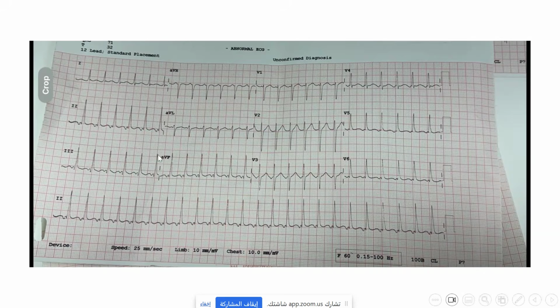If you look to the P wave in long RP tachycardia, considering the patient is young and the P wave is inverted, likely it's not sinus tachycardia. So atrial tachycardia is a possibility in this patient, and the other one is PJRT.